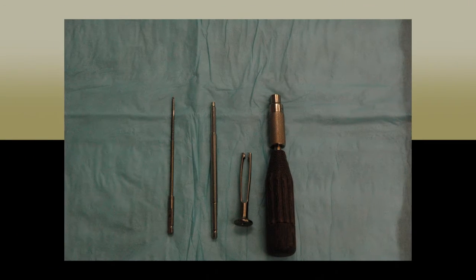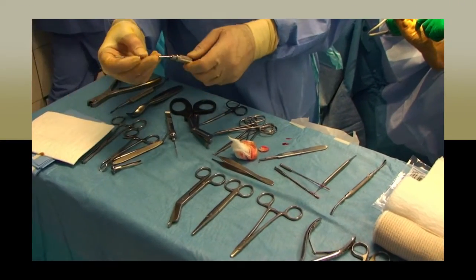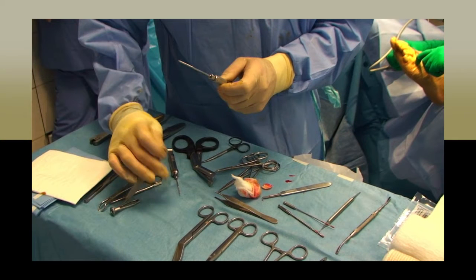The screwdriver comes in two pieces as well, the handle and the head that holds the screw. Much like the drill, you will push the guides at the top of the handle forward and place the head of the screwdriver into the handle. Release the guide and the handle locks. This will be done for any surgical case requiring a screw.